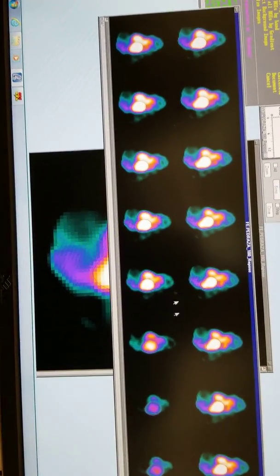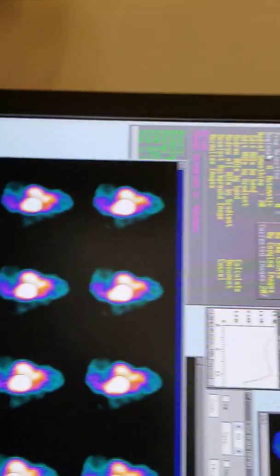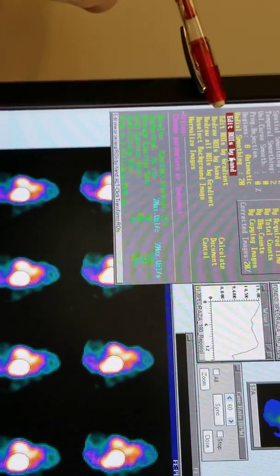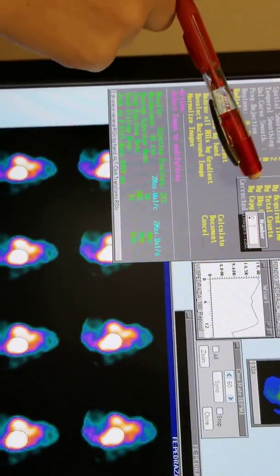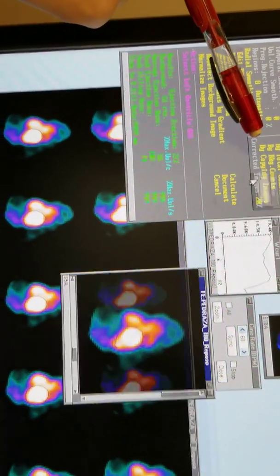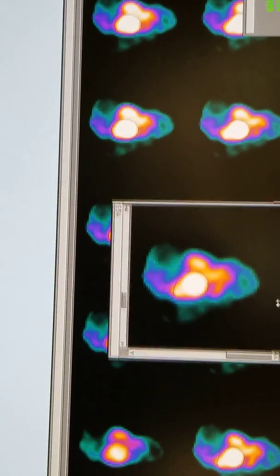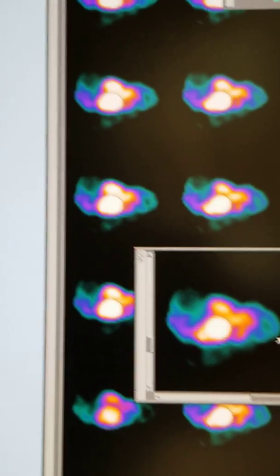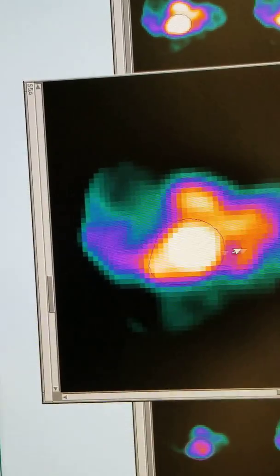So the way that I do that, I go back to the yellow box, edit ROI by hand. That little box there, we're going to put in a 5. Bam. And it has pulled me up. Very first thing, readjust the size. Very first.